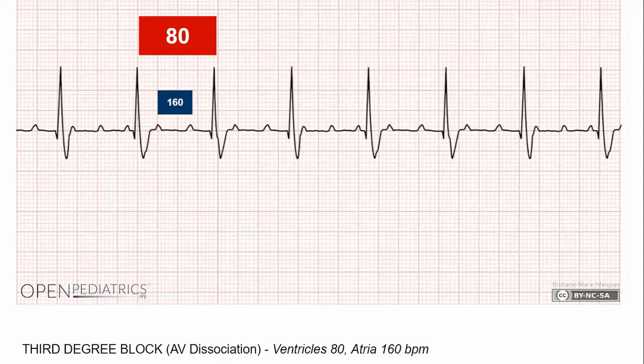When we look down here and see the PR intervals, really short, really long over here, maybe a little bit shorter but still pretty long. Short, longer, longer, short. Again, no rhyme or reason. It's not like Mobitz 1 where it gets a little bit longer and then you have a drop beat, the Wenckebach.